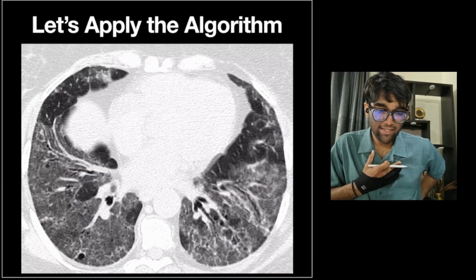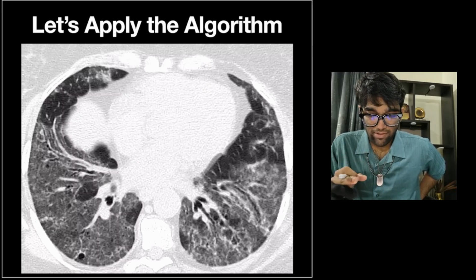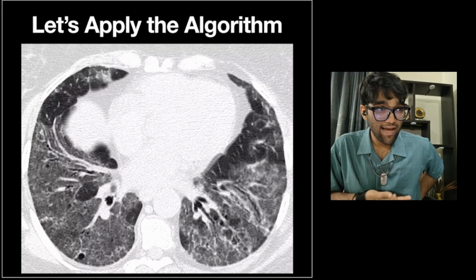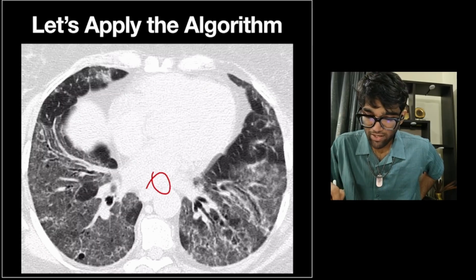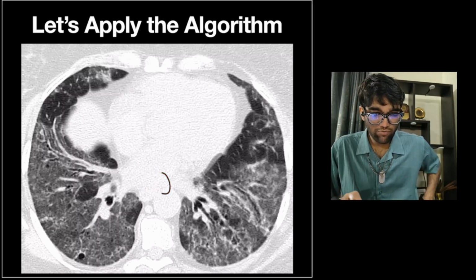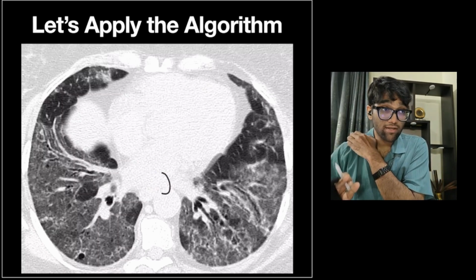Now again, in this example, let's apply the algorithm. One thing that is very obvious immediately is that this is an axial cut through the base of the lung. Why do I say it is the base of the lung? Because I can no longer see the trachea. So this is the base of the lung, the two lower lobes. And yes, there is a lot of ground glass opacity. We'll go step by step.